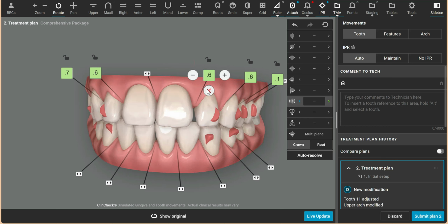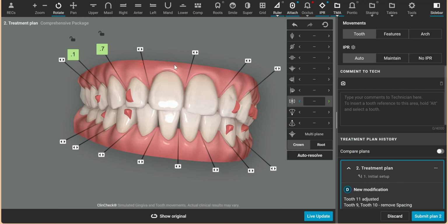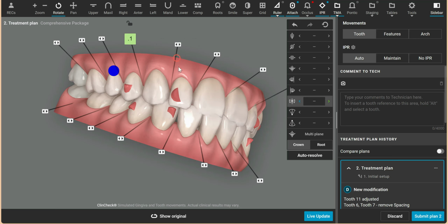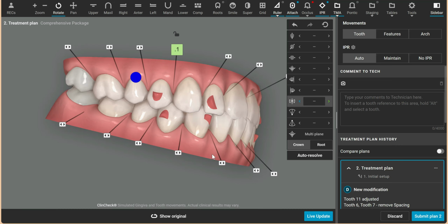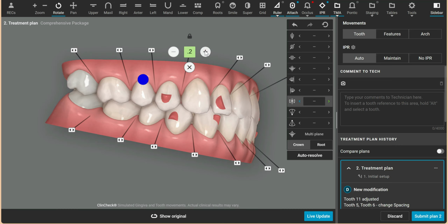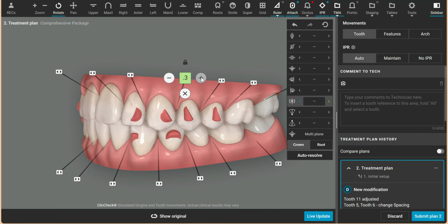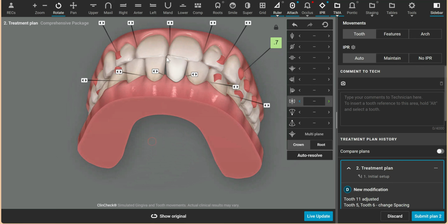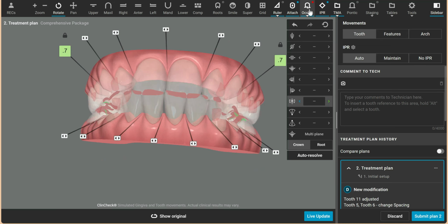So now what we have to do is we have to close the spacing. And when we close the spacing, you're going to see because there's a tooth size discrepancy, your options are either you add restorations to the lateral incisors, or if you want to close all the space, I'm going to just relocate some of the space, just for now anyway, distal to the upper cuspid teeth. And even when I do this, after closing the spacing around the laterals in the treatment plan, there are premature contacts here. They're going to show up heavy right there. So we have to resolve that.